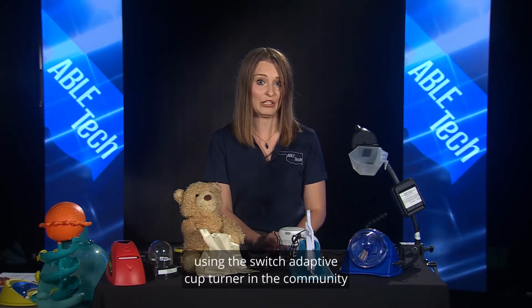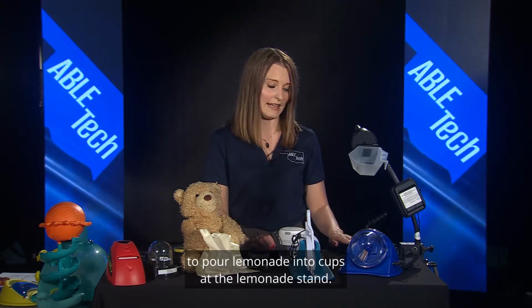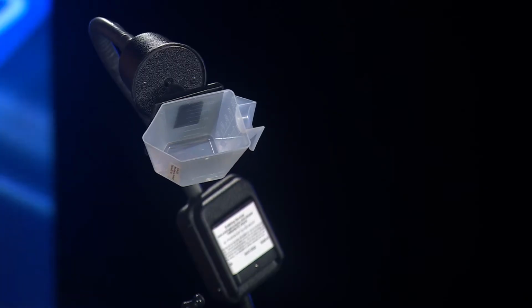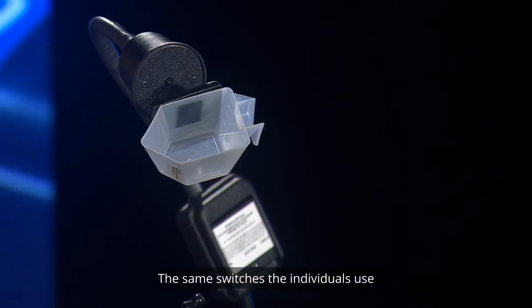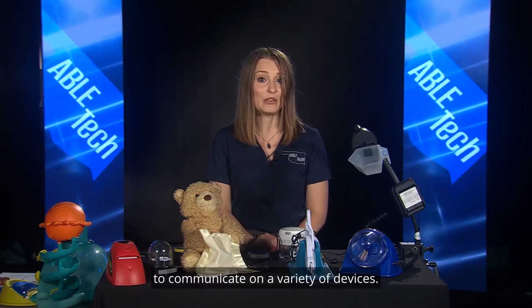One of my favorite stories is about a young boy using the switch adaptive cup turner in the community to pour lemonade into cups at the lemonade stand. The same switches the individuals use to activate the fan or toy can be used to scan and select choices to communicate on a variety of devices.